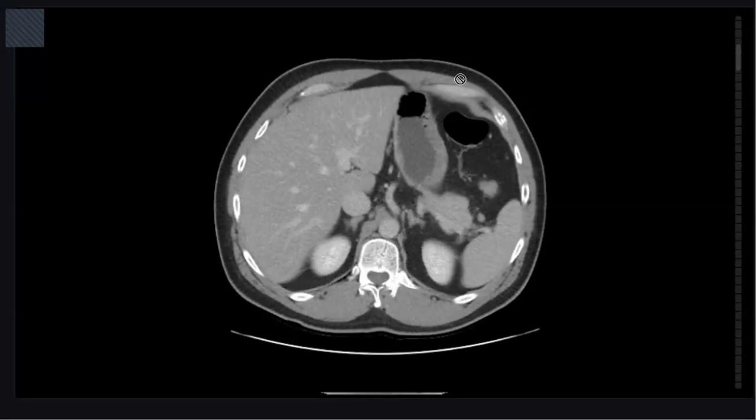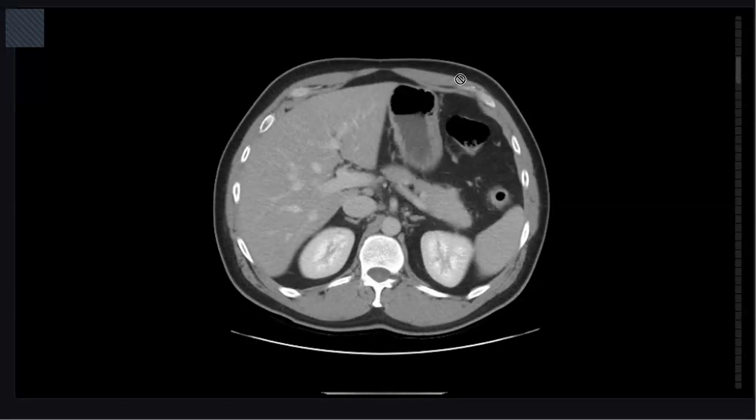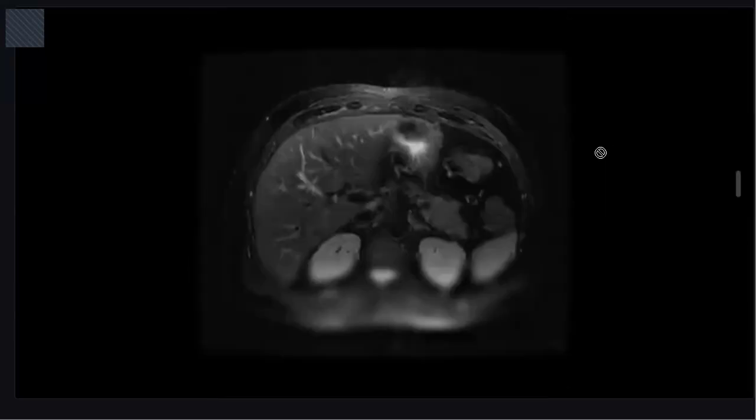It is iso here, but not enhancing. Also the possibility of a small cystic lesion could be in the differentials, like mucinous cystic neoplasm. I will use the pancreatic protocol for a triphasic study for assessment of the differential.